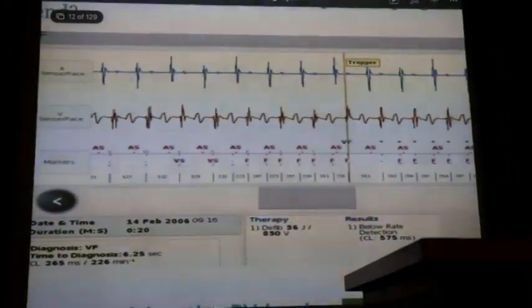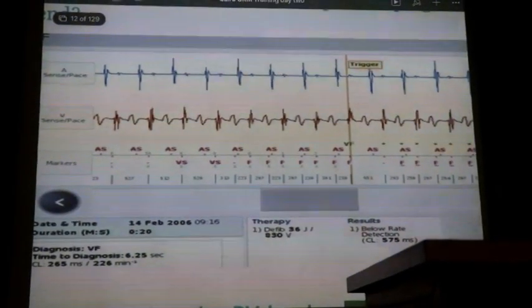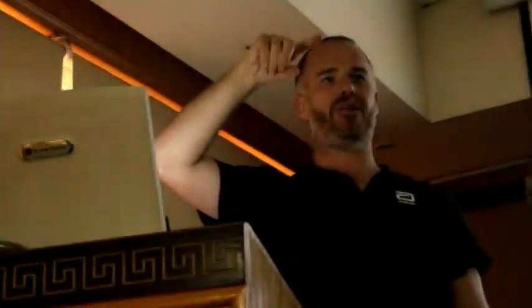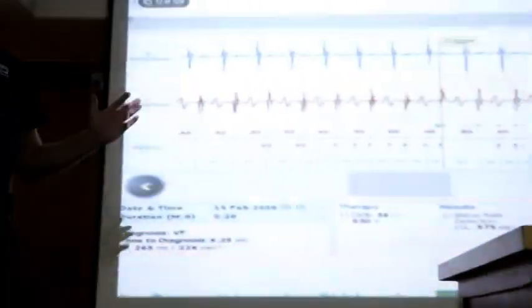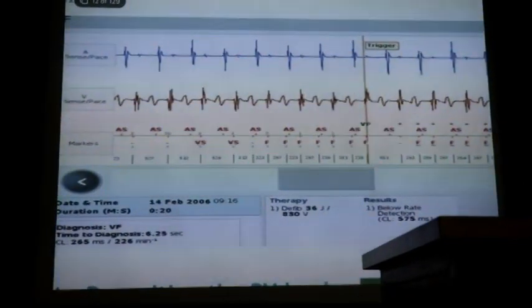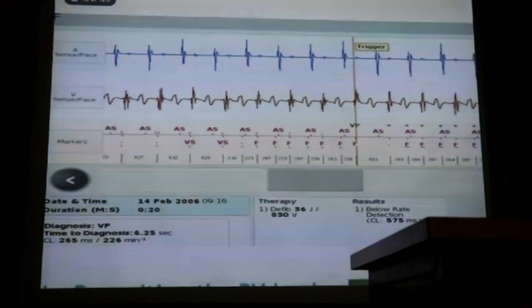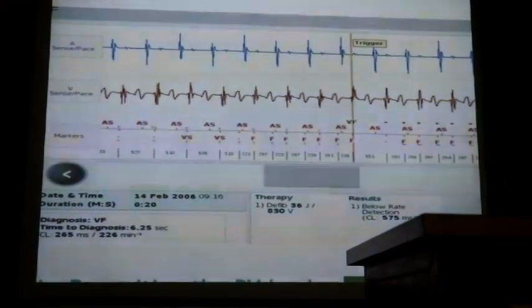And what's the R wave here? The measurement of the R wave. 3. So R wave is 3. The device is going at 50% of 3, it's 1.5, and then declining down. And this is almost always what you see. Almost always, if you get T wave oversensing, it's this. Remember, contemporary devices, you are not going to see this with our new devices. We can make this disappear.